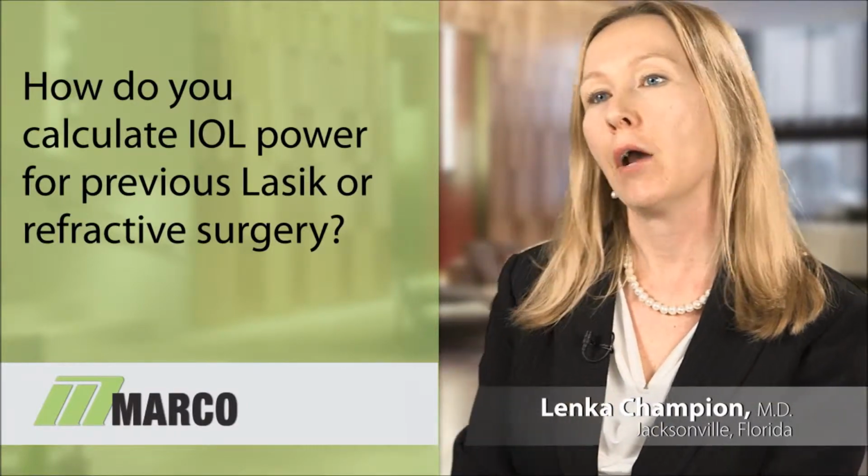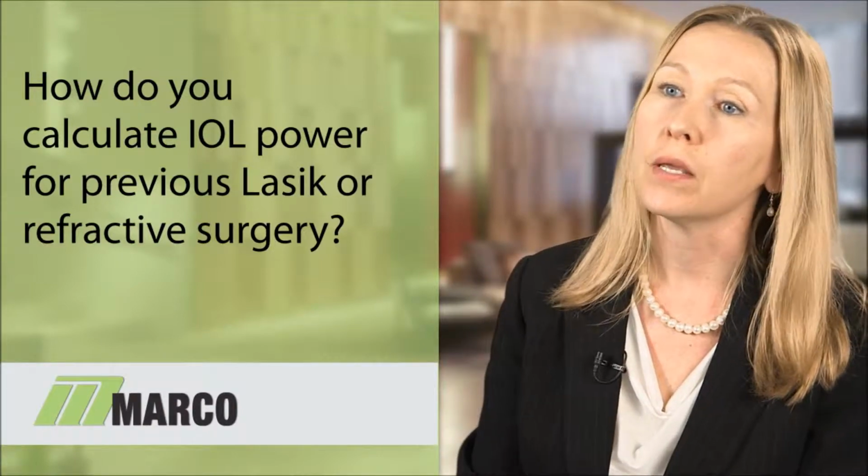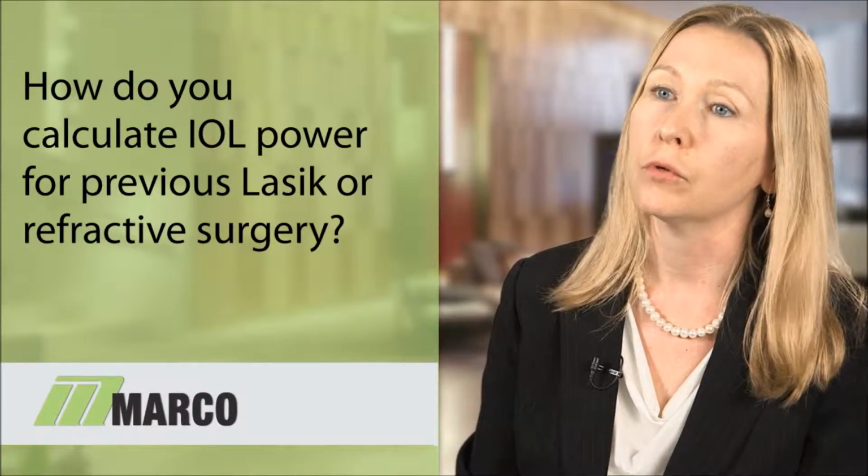So this is where I found the OPD truly fascinating. As we all know, we can use different methods to calculate IOL power after refractive surgery. All of these methods have been proven to be less than ideal, and the fact that we still don't have a method just shows that we do not have a great way of calculating that central corneal power for post-refractive patients. In my experience, what I have found is that the ECCP, the estimated central corneal power, the number that we derive from the OPD, is a very, very useful number to use for patients in post-refractive cases.